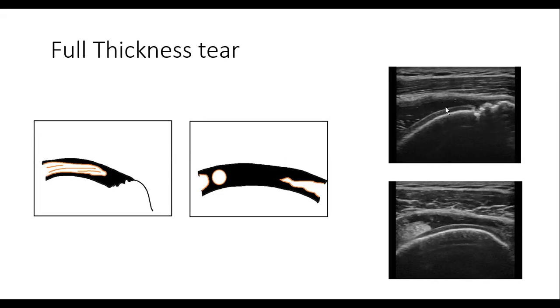So what's happening here is you don't have the tendon, and now there is less impedance to the transmission of the ultrasound beam. So articular cartilage, which is supposed to be anechoic or hypoechoic, now because there is no intervening tendon and fluid transmits ultrasound much faster, we're getting more echo back from this cartilage interface.